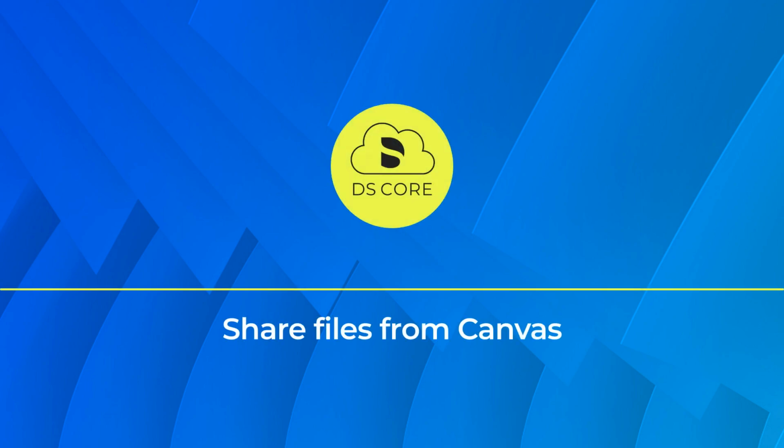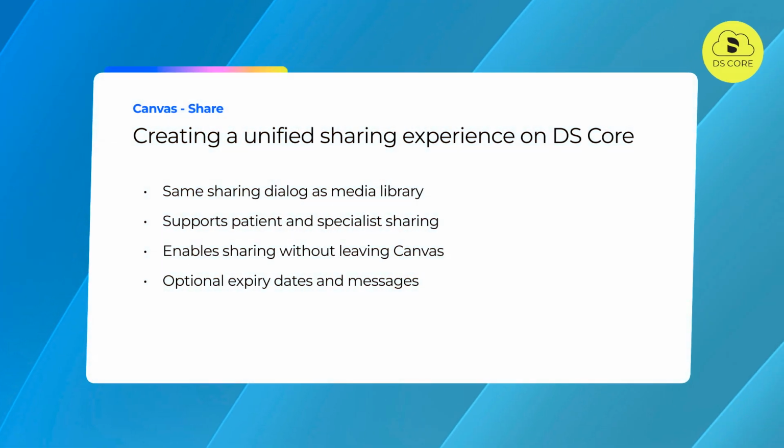In this tutorial, you learn how the new adjusted sharing dialog enhances communication directly from the diagnostic canvas. This update introduces a unified sharing experience, making it easier to share images with patients and specialists without leaving the canvas.